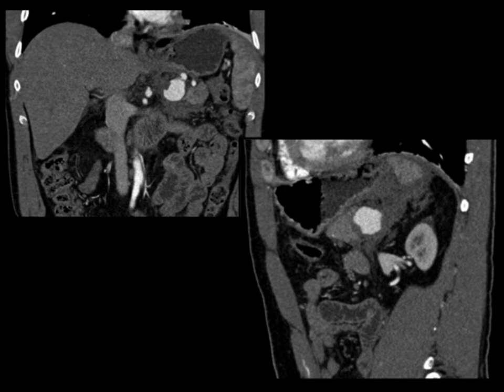Now, it's interesting, most of the cases I've mentioned to you, you can see problems. And then when you have the problem typically is that something is easy to miss. It's like a splenic artery pseudoaneurysm or an aneurysm. Every once in a while, and then I showed you also how you can be fooled and call something a neuroendocrine tumor of the pancreatic tail, where it's really just accessory spleen.